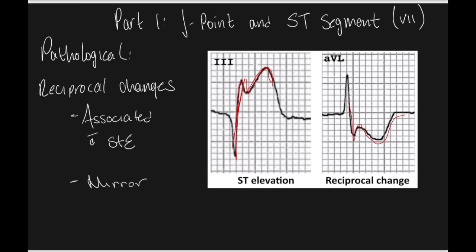And that makes sense because the ST depression, or the reciprocal change, is looking at the same event, that infarct, but from the opposite side of the heart. So instead of having that elevation, you have the depression, but since it's the same event that's occurring, they should look very similar.